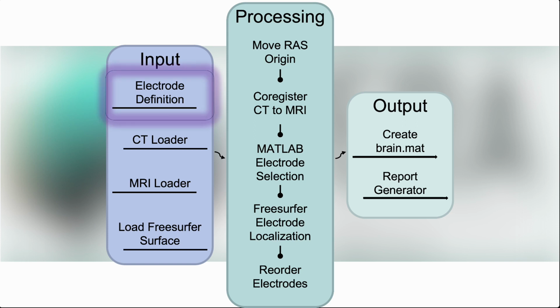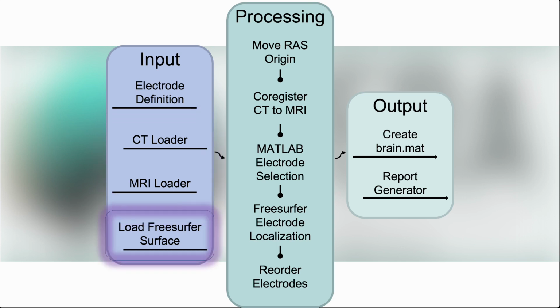The electrode definition includes details about the implanted electrodes, including the type of implanted electrode, electrode names, number of electrodes on each implant, inter-electrode spacing, and electrode volume. The CT and MRI loader components can load DICOM or NIfTI files into VERA to allow for co-registration later. Finally, the FreeSurfer surface loader component loads the FreeSurfer segmentation surface. If you have not already generated the FreeSurfer segmentation, you can replace this with a FreeSurfer model generation component in the pipeline file. We'll talk about this more in the VERA extended use tutorial video.